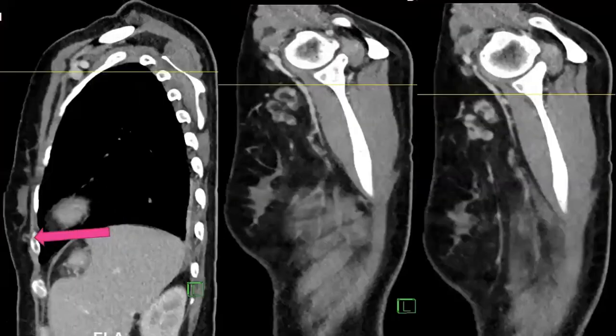And this is the lesion on the sagittal view, and look at the axillary lymph nodes, they are heterogeneously enhancing. And even the surrounding, there is nodal edema and some enhancement, which is unusual with just reactive adenopathy.